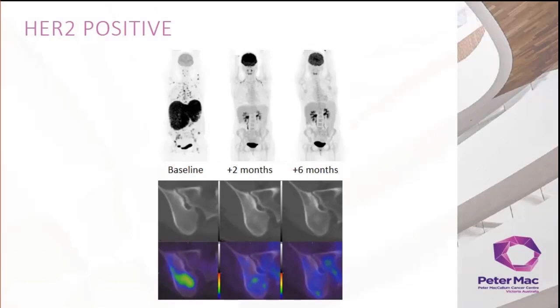We still, unfortunately, see this as interpreted as progressive disease on CT. So with the knowledge of the PET findings, we have further confidence that this is not progression on CT. This is simply a sclerotic healing response.